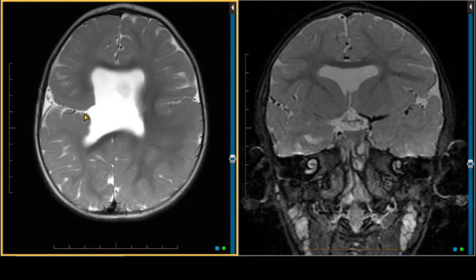Now, a closed lip schizencephaly is where the gray matter margins are up upon one another, and an open lip is where they're widely apart. Now, from my perspective, it's parsing terms to debate whether this is open-lipped or closed-lipped schizencephaly, because either way, the parenchymal defect is relatively small, and so we're missing a small amount of brain. So whether you call this a closed-lip schizencephaly or a very narrow open-lip schizencephaly likely has no clinical differentiating features. The issue is that there's not a large gap where there's brain parenchyma missing. So this is a patient with septo-optic dysplasia and a closed lip versus a narrow open lip schizencephalic cleft.